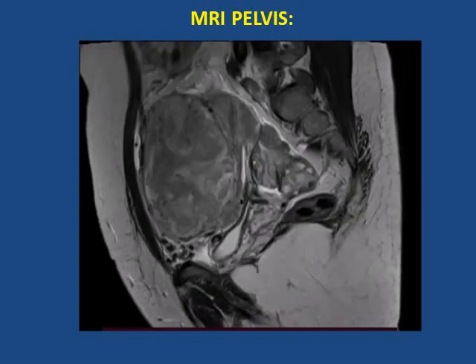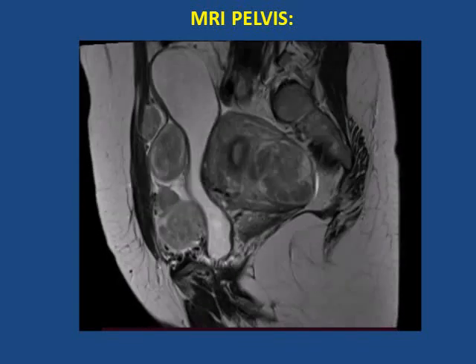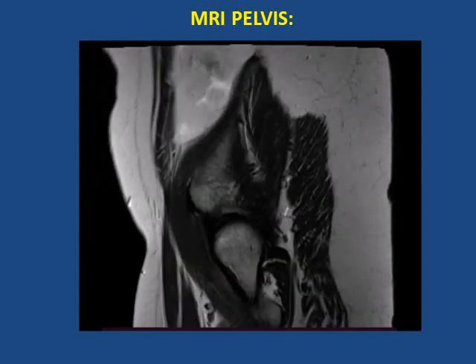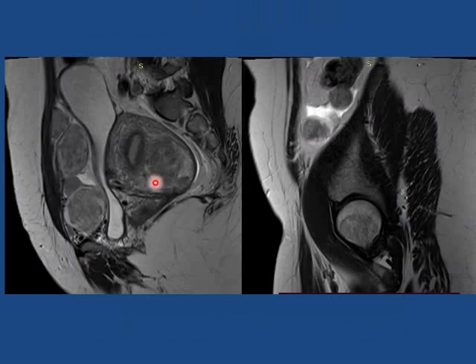These are the T2 sagittal images. Again, similar lesions are well appreciated attached to the anterior abdominal wall with compression of the urinary bladder. These are two spot images I have taken. Here we can see all the anterior abdominal wall fibroids attached to the anterior abdominal wall in the prevesical space, and the urinary bladder is distorted between the uterine fibroid as well as the pelvic peritoneal fibroids. There are similar appearing lesions also seen on the pelvic peritoneum here with a minimal amount of ascites.